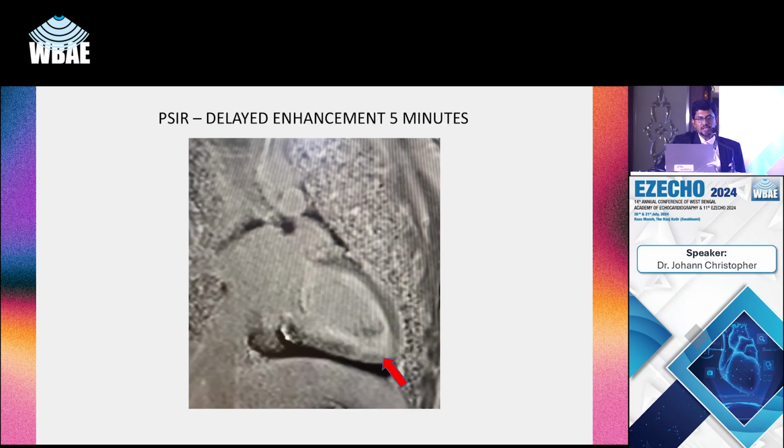First one is a global subendocardial scar with a high possibility of amyloidosis. The second is a global mid-myocardial scar and amyloidosis confirmed. And the third is no scar with most probably a triple vessel disease patient. And the last one is a patient with a diffuse scar with underlying coronary artery disease, triple vessel disease.